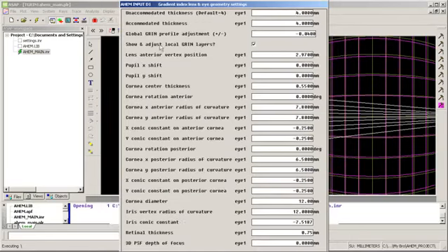So I click OK, and I've got my next splash screen that's more dedicated to the gradient index lens geometry settings. So I've got an unaccommodated thickness and an accommodated thickness. So what we can use this for is if we want to put accommodation on the lens, or if we want to simulate aging and the thickness associated with aging.